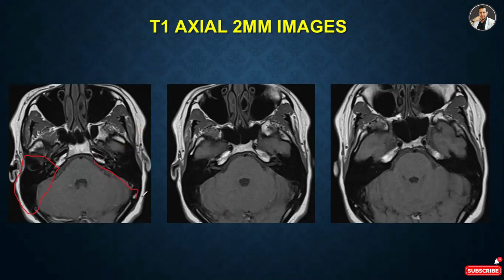This is the bone area. This is the nerve. This is the nerve. And this is bone.